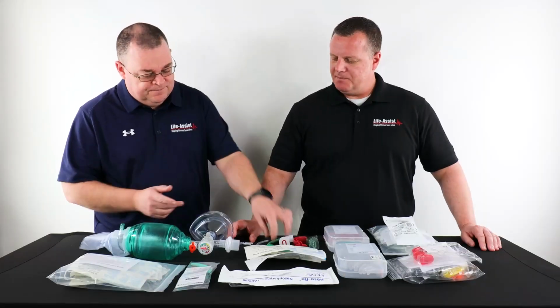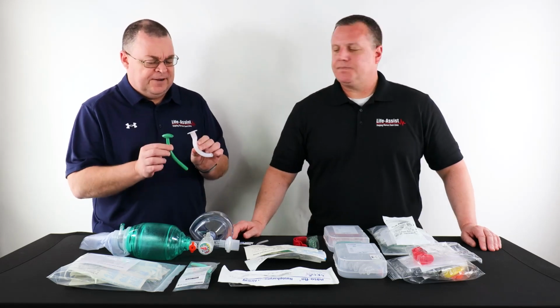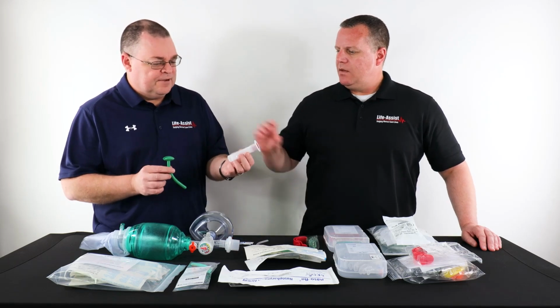Yep. They definitely physically look different, though. Yeah, there's a lot of different makeup and anatomy of the device itself. So you want to go over the key points of those things?